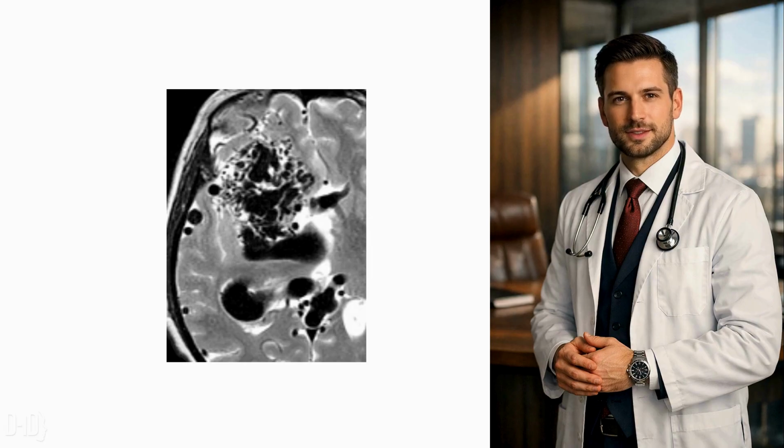Arteriovenous malformations, AVMs, are characterized by an abnormal leash of vessels allowing for arteriovenous shunting. They can occur anywhere in the body but are most common in the brain. There is direct arteriovenous communication with no intervening capillary bed. They can be congenital or acquired. T2 axial imaging demonstrates numerous serpiginous flow voids consistent with a very large right-sided arteriovenous malformation, AVM.